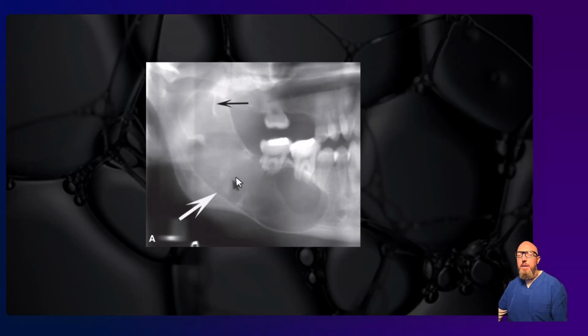And so how expansile is it? What's the expansion pattern of this? It's more up and down the bone following the length of bone. We can't really see the buccal lingual, but it doesn't look like it's that much buccal lingual, and not so much inferior superior, or in this case, mesiodistal. And so this expansion pattern is more similar to an OKC as opposed to ameloblastoma. Again, those would probably be top of the differential, those two. But that's what this ended up being, an OKC.